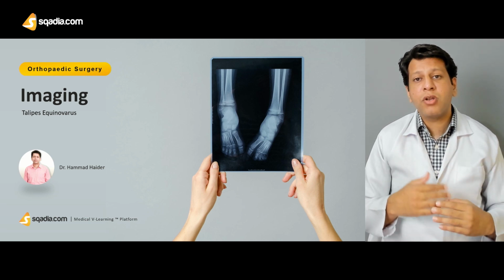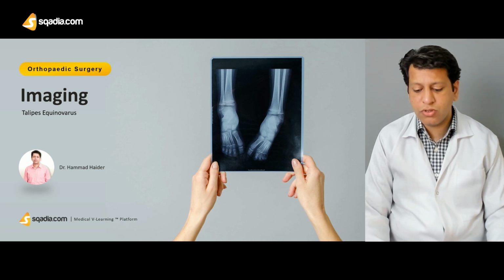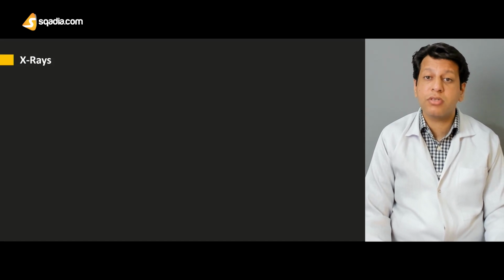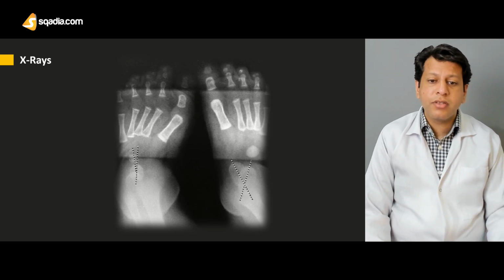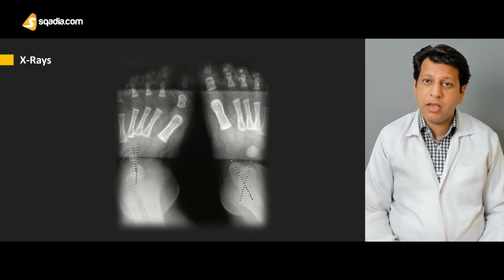This is very important to understand, because if the views are in plantar flexion, then we may not be able to assess the pathology which is present in the bones, and they may look very much normal. Therefore, whenever you are getting an x-ray, you have to order an x-ray AP and lateral view in maximum dorsiflexion, and both have to be taken separately. We have to calculate certain angles on AP as well as on the lateral view.